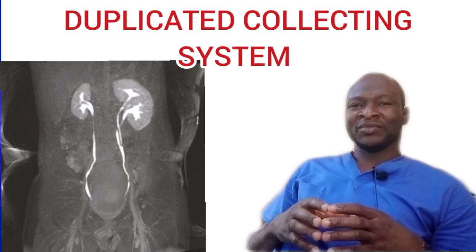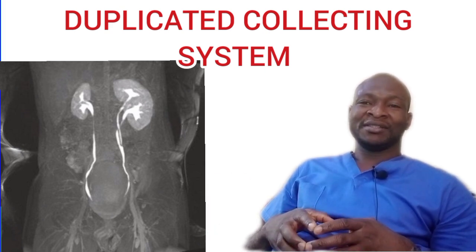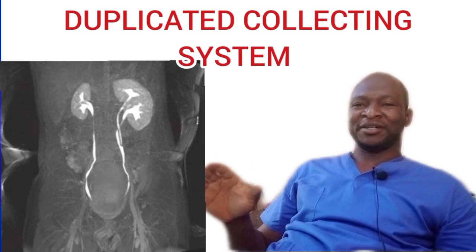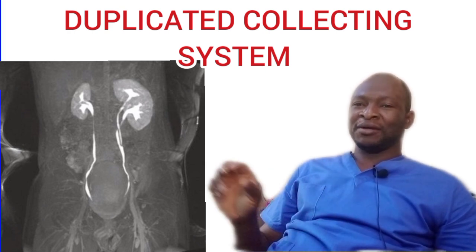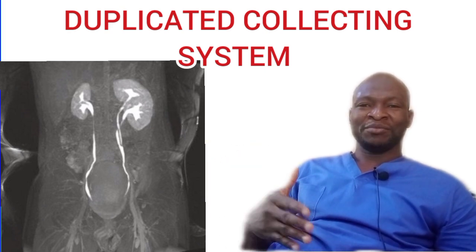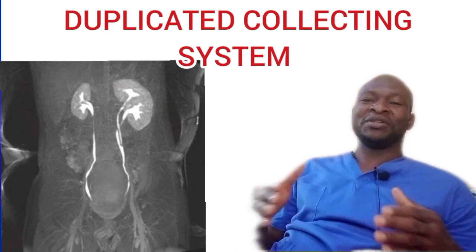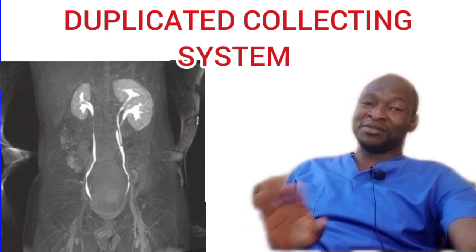So let's take a look at it. This is a very common renal anomaly with unilaterally enlarged kidney, seen in like 1% of the population. In ultrasound, you will see an enlarged kidney with a large cortical area between the separate renal sinus and the pelvises. Now, two common types are seen. There is the incomplete duplication, mostly common and involves two complete separate renal pelvises with fusion of their ureters. So only one ureter inserts into the bladder. The insertion site into the bladder usually is normal.